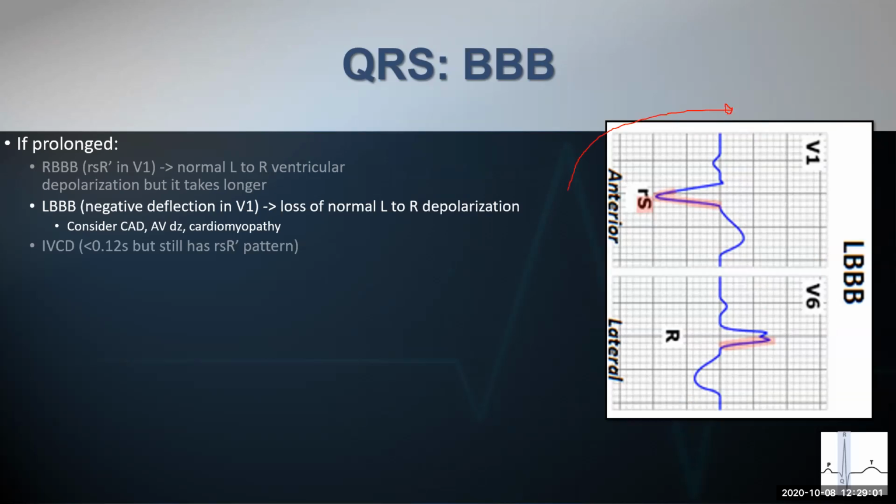And then if we were to go back to the right, if I were to rotate this 90 degrees, you can see the QRS complex for the most part is pointing to the right side. So that'd be a right bundle branch block. I don't recommend you use that as your primary method for determining these, but it's just something to remember. So let me just go back to sharing the PowerPoint.